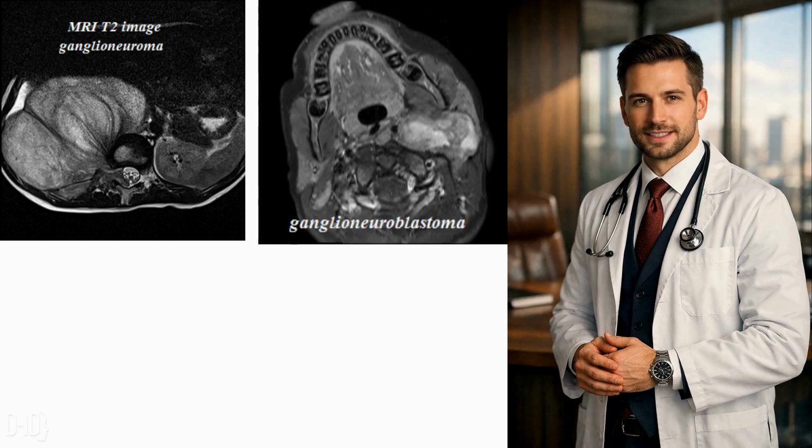Here's how to think in exams and practice. If there are bright T2 plus delayed enhancement, plus vessel encasement without invasion, this pattern is suggestive of ganglioneuroma. While if there is a heterogeneous mass plus necrosis plus aggressive features, invading near vessels, this pattern is suggestive of ganglioneuroblastoma.